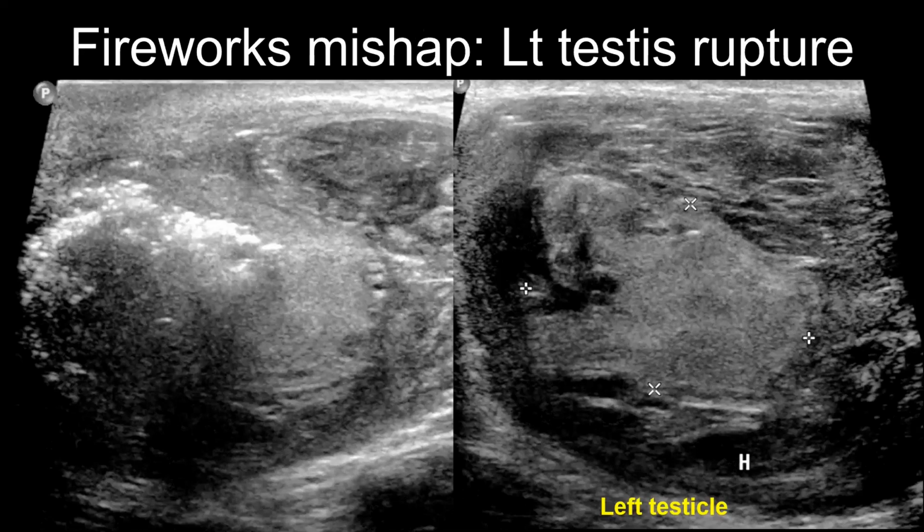And this was a patient that I saw on call, fireworks mishap to the scrotum, and we can see extensive gas in the soft tissues. It primarily involved the left part of the scrotum. A huge hematocele surrounding this very, very irregular left testicle that was completely disrupted.